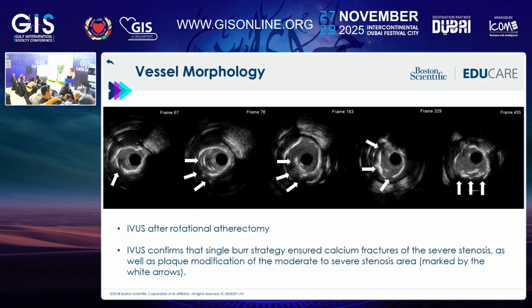So it's very important. How does IVUS help us in deciding the balloon size? You do have the area of the distal reference diameter. When you are dealing with the post dilatation, it's very clear. You don't want to surpass or use a balloon more than the external elastic membrane. But for the pre-dilatation, you could use the same rule minus 0.5 to 1, so absolutely you can use that for the pre-dilatation.